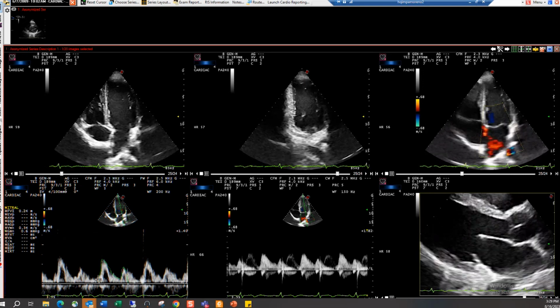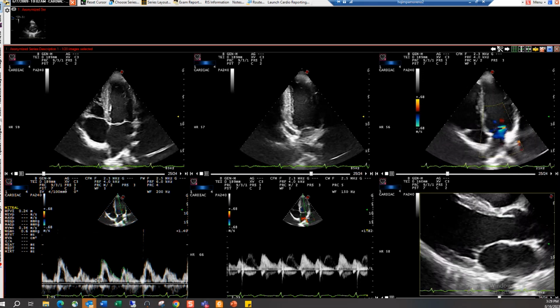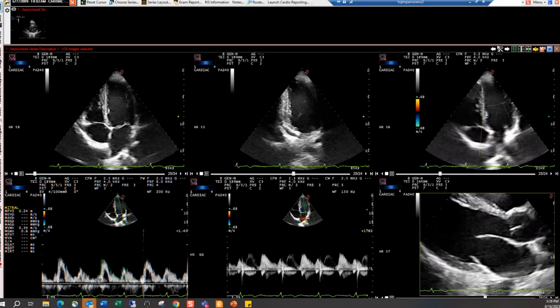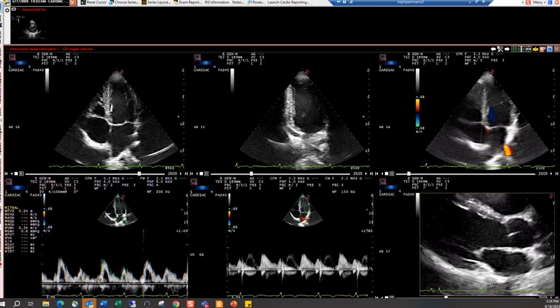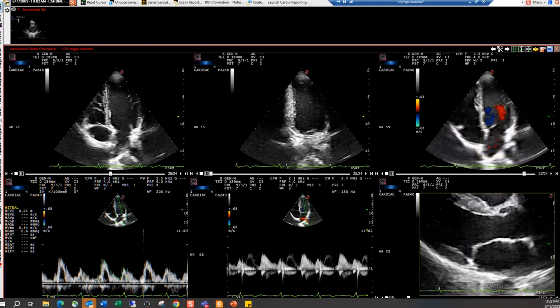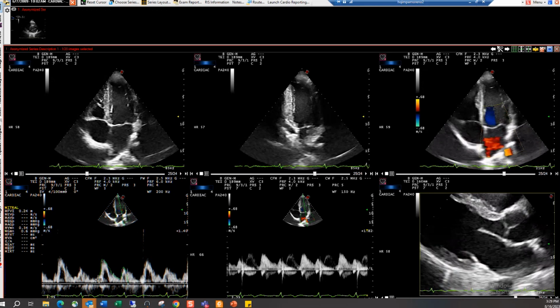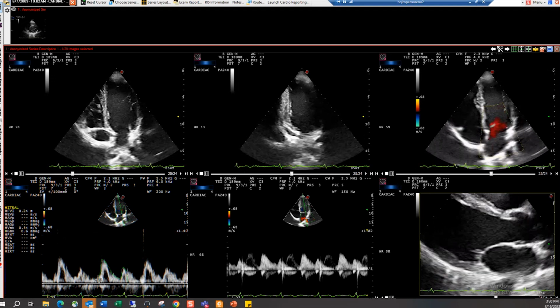And then when the cardiologist opens it up, seeing the images on one side and Encapture MD on the other, all he or she needs to do is basically read the report that's being generated and then click on those particular sentences if there's no agreement with the sonographer on a particular area and it needs to be changed. So we have different versions, and you will work with the teams to gather workflow. That's primarily what I do, to see what's happening in the facility and how best Encapture could work with your particular flow.